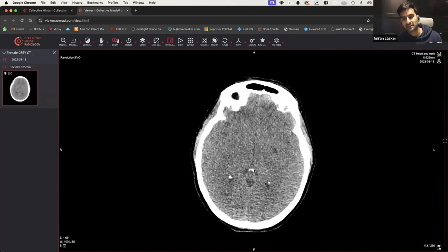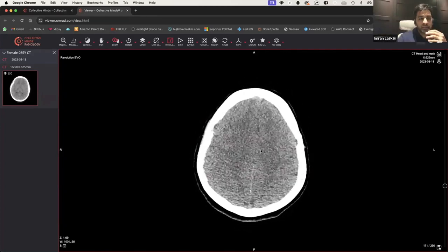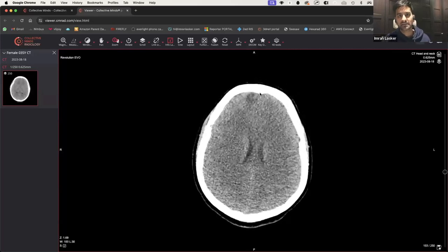posterior fossa mass either. So this person was a trauma. And when you have trauma, what happens is these acceleration-deceleration injuries, right? So you're going to go forwards and hit the front of the head. And then that acceleration-deceleration injury will normally end up having injuries in the frontal lobes and in the temporal lobes. So let's have a look at that frontal lobe.